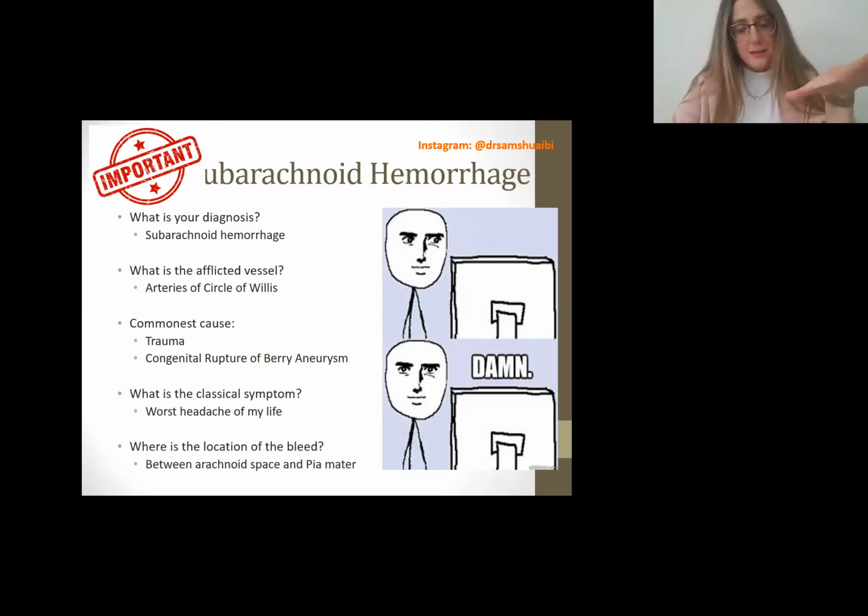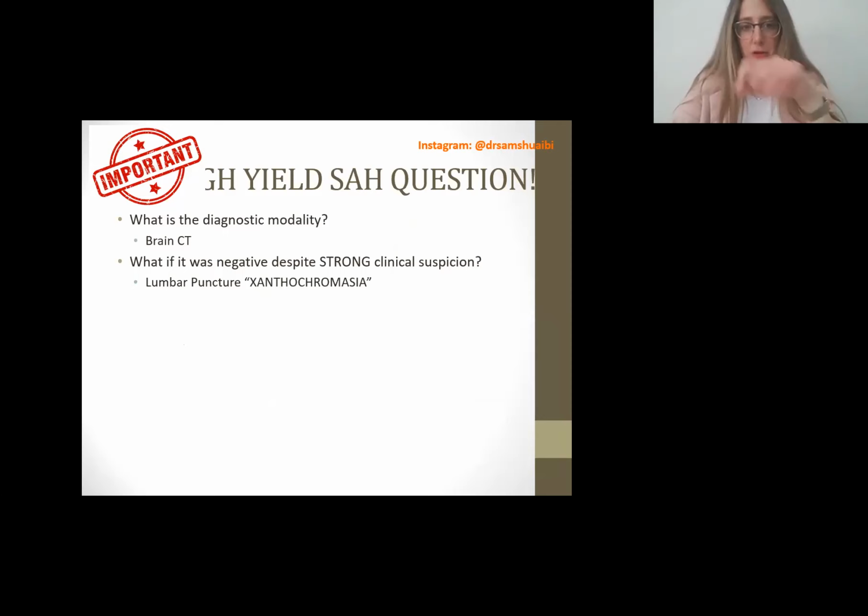Okay, where's the location of the bleed? I have seen this: between the arachnoid and the pia. Please, guys, make sure you memorize this. Make sure you know it very well. And there's a little bit of a surprise for you after this one.